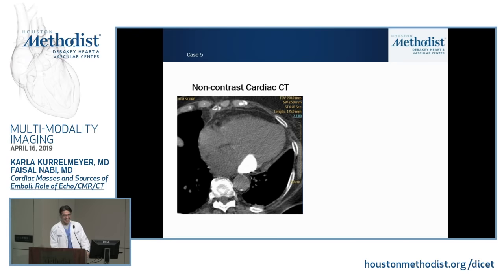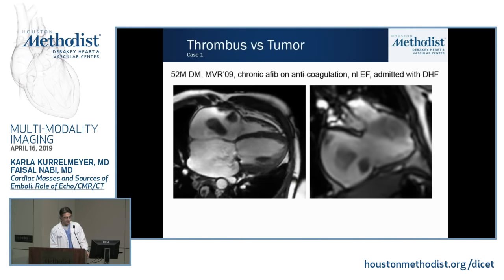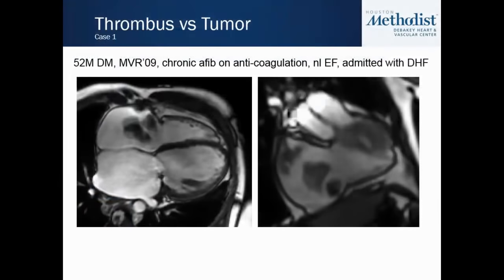All of these diagnoses would have been made in 5 seconds with CT. You see a stone in the heart. So, another example of a stone in the heart, Danny. And of course, I'm not going to deny the echocardiographers, if you were to look at the echo, most of us would have made that diagnosis on echocardiography. So again, just the importance of differentiating tumors from pseudo-tumors.